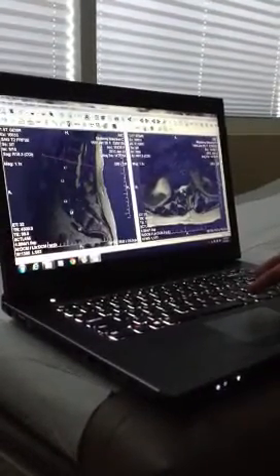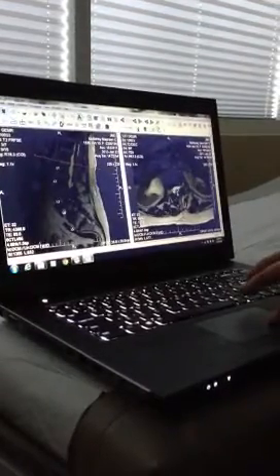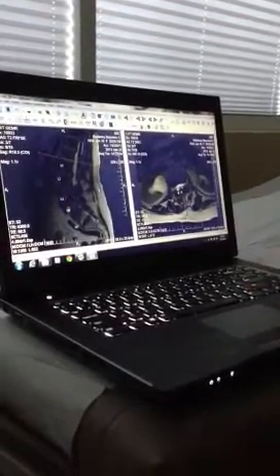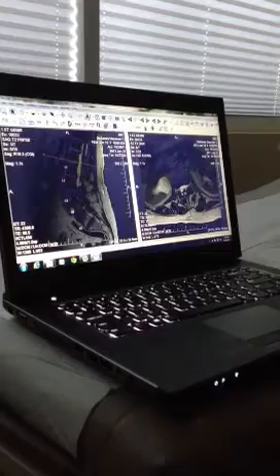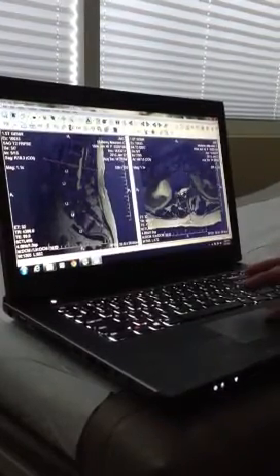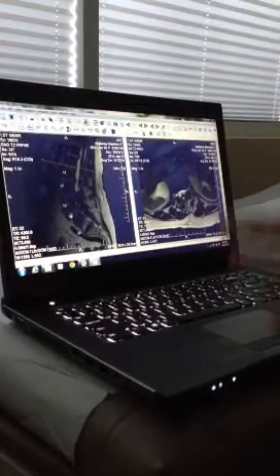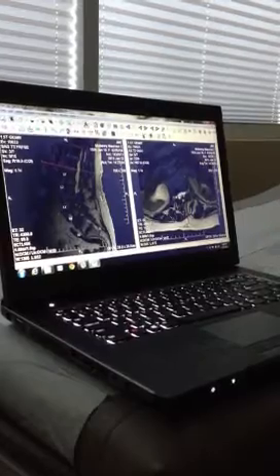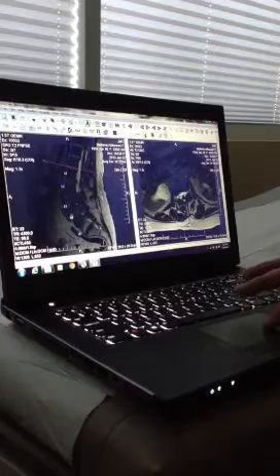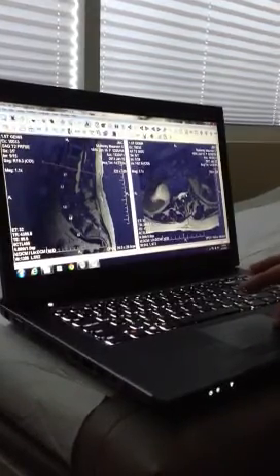So, this is the spinal cord. We're still at the level of the spinal cord, and this is what the spinal cord looks like. You have a very nice, capacious area allowed for the spinal cord at this level because there's no stenosis. And where my pointer is right now, can you see that? That's where the nerve exits. That nerve exits through what's called the foramen. This is the foramen right here. Make sense? This is the foramen on the other side.